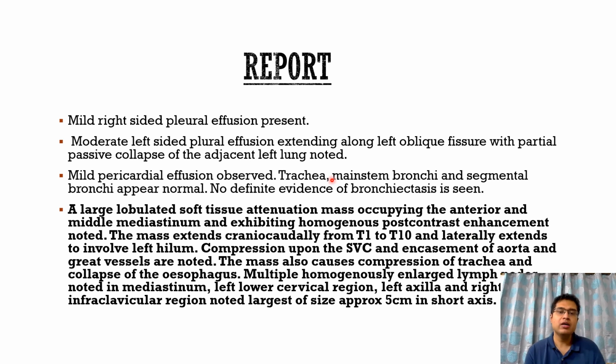So lymphoma typically shows homogeneous post-contrast enhancement and multiple enlarged lymph nodes, and does not infiltrate the vessels, rather compresses them. So this was a typical case of lymphoma which was diagnosed incidentally.